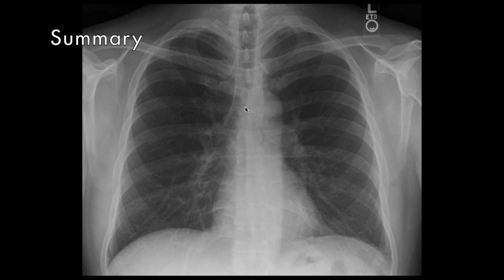In summary, this is a plain chest radiograph, a PA film of an anonymised patient. There are no striking abnormalities, and this would be consistent with a normal chest radiograph of a healthy patient.